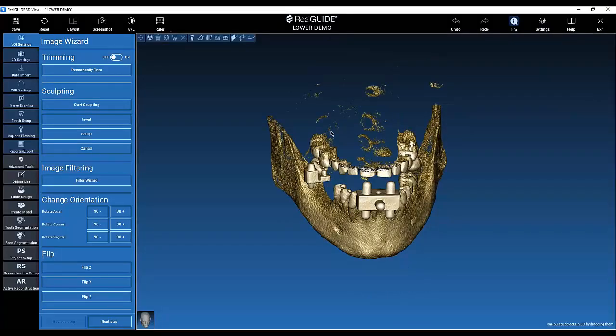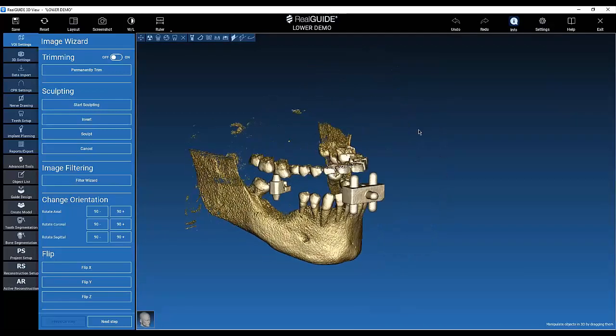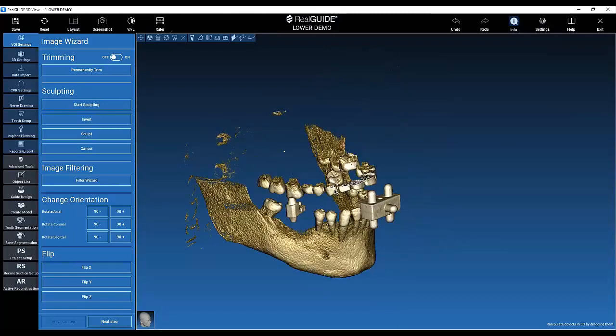Yes. Okay. This is the main patient window, as you can see here. I want you to pay attention to the left side of the screen. You can see a lot of different icons here with the different workflow steps. These steps are already in the correct order, in the correct workflow. So if you follow them, you will go to the end of the workflow. It's like a wizard guiding you through the workflow.